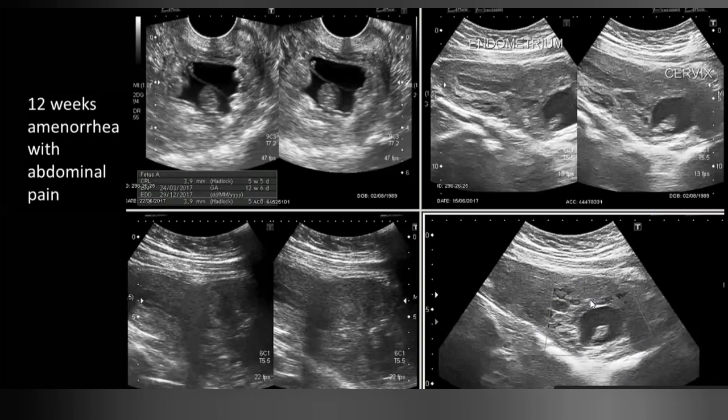And the third thing is, the scar pregnancy can be endophytic or exophytic. So it may pass into the scar, implant there, and may extend outside also, when it's called exophytic, or when it extends more within the endometrial cavity, it is called endophytic.